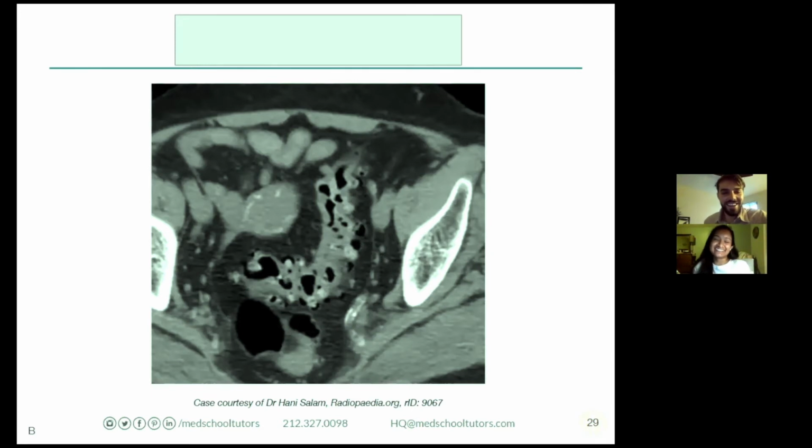All right. Okay. So again, I think the first thing you've got to do is orient yourself. So I have my patient's legs coming down at me. It looks like I'm seeing two bony processes over here on the side. This would be consistent with probably the pelvis here. So I'm in my lower abdomen. So that helps me think initially about my differential, even immediately.